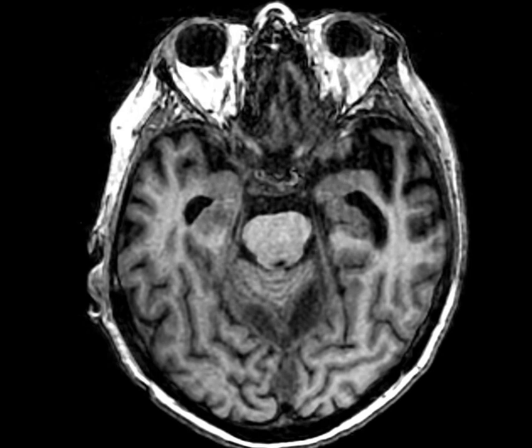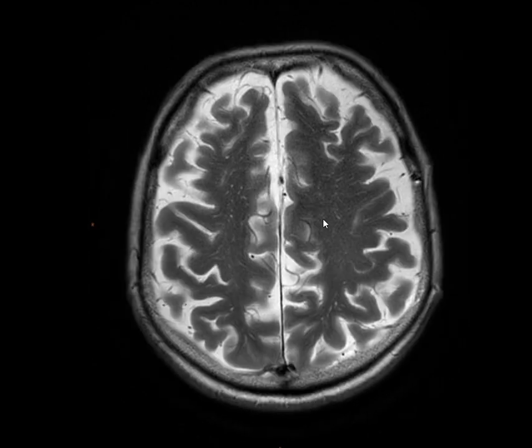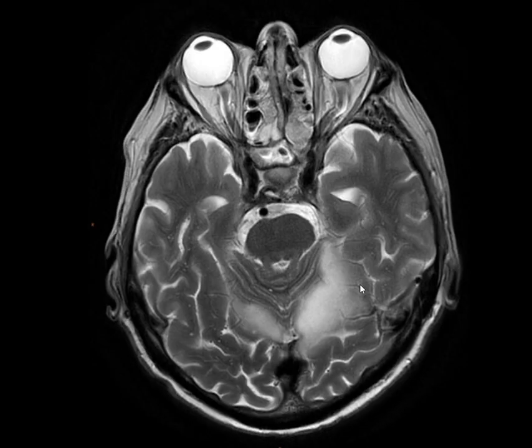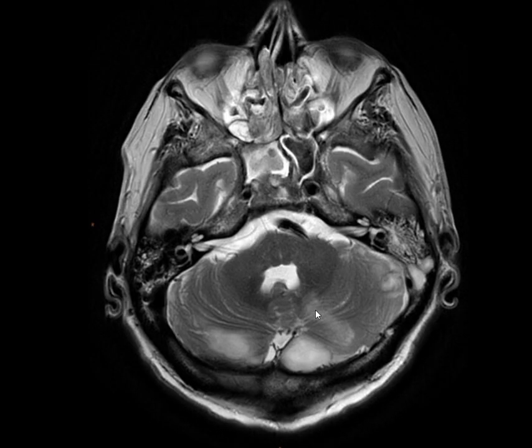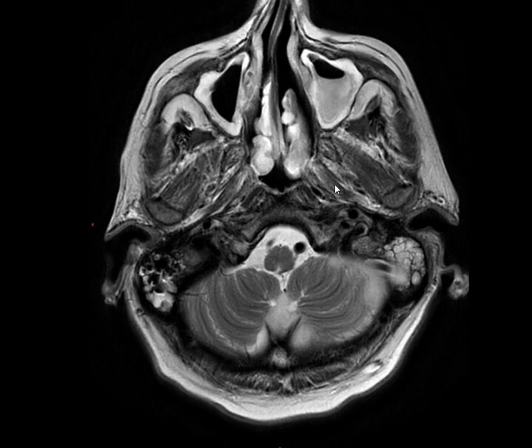Later on, patient was advised for MRI. Here now, let us see first in T2 how it looks. So T2, we can see the area of abnormal FLAIR hyperintensity, T2 hyperintensity, and this is not as that of our CSF, and it is involving the left cerebellum. So definitely there is the left cerebellitis, and this is the mastoid.